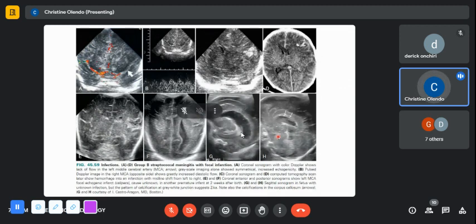And in G and H, these are cases of Zika virus causing meningitis, and you can see there's calcification of the gray-white matter junction and also calcification of the corpus callosum, denoted with the arrows in that area. So this was more of a chronic infection, or the patient had it in utero. You can also see how geographic they are.